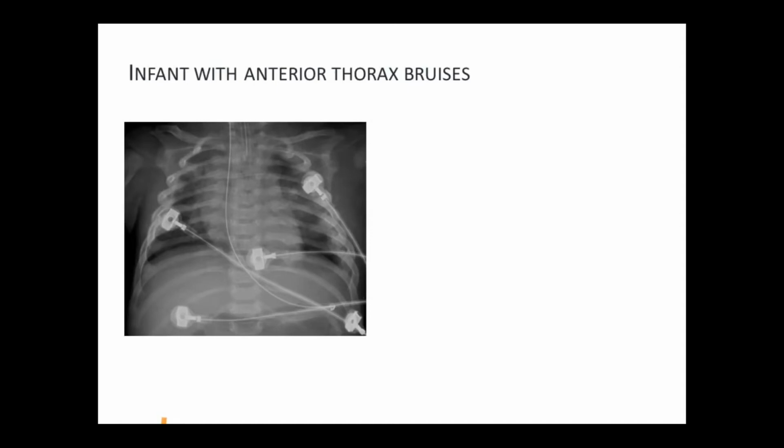The vertebrae are clearly visible through the heart, 8 to 9 ribs are visible, and the clavicles are equidistant from the spine. Please note that this film has been darkened in order to enhance the pathology. The thymus is not visualized and no masses are seen. The heart is a normal size and shape. There are no areas of hypo or hyperlucency and no signs of a pneumothorax, pleural effusion, or pneumonia. The diaphragms do not seem to be flattened or elevated.